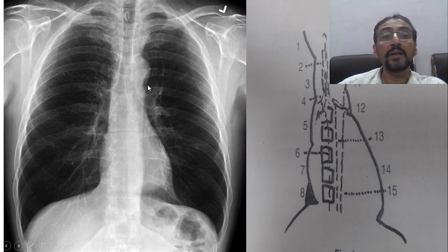that is a very important area. What is that? The aortic knuckle. The aorta that came out from here and comes like this and arrives here, this particular curve that you see here, this area actually refers to the aortic knuckle. So identification of the aortic knuckle is very important. This curved area is the aortic knuckle. And just below the aortic knuckle, area number 11, what is that?